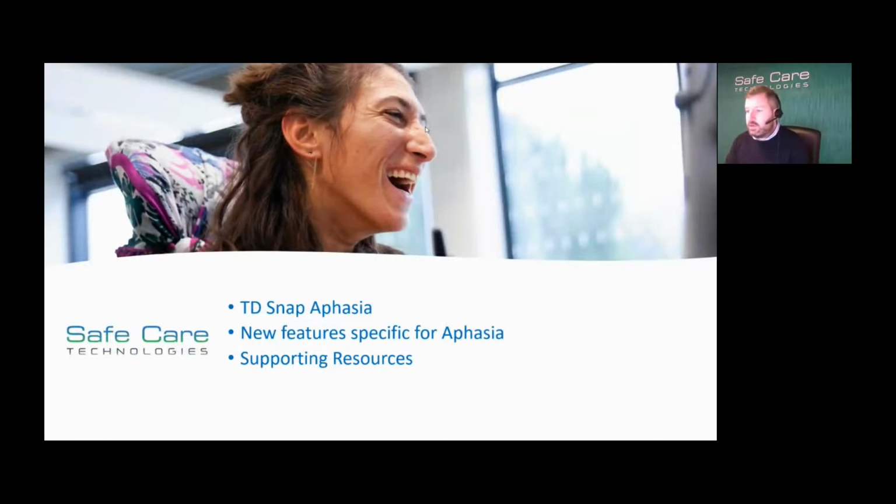So today we're talking about AAC for aphasia. We're going to focus primarily on TD Snap Aphasia, look at the new features within it that are specific for aphasia, and then the supporting resources to help therapists, family members and users alike to support them in their language and therapy.